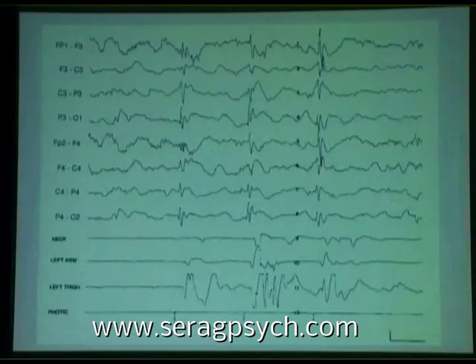Anyway, next, please. And photic stimulation is extremely valuable in patients with spike waves. As I said, it's a highly abnormal phenomenon to have a single flash rate elicit a spike wave. Always indicates a degenerative disorder without question. Next, please.